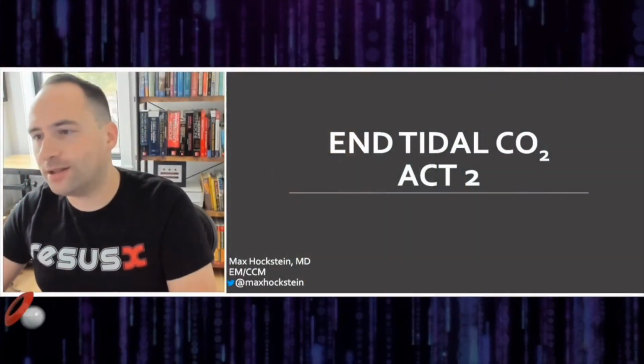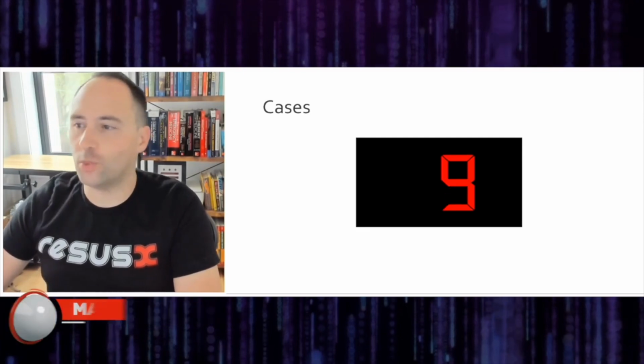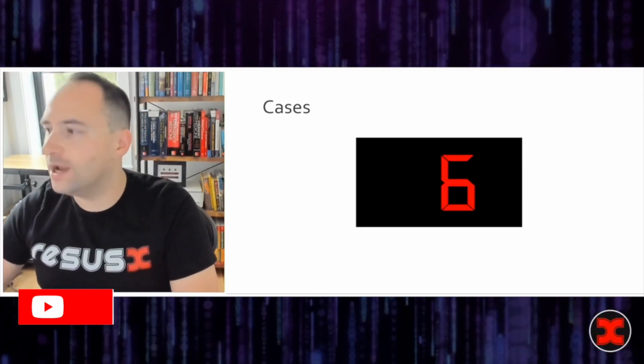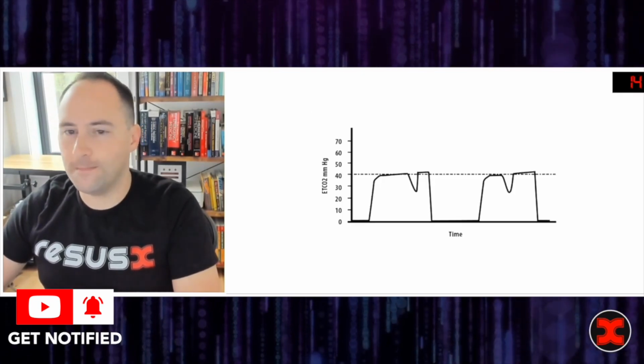Welcome back to End-Tidal Act 2. Now we're going to do a bunch of cases. You will have 15 seconds to look at the waveform and come up with a diagnosis. I'm ready if you are. Case 1.